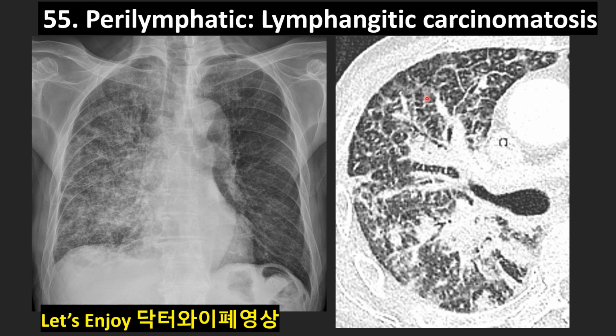Oh, uncountable. So many pleural nodules, so many nodules and masses in the bronchovascular bundles, even without normal findings. And we see many septal lines thickening over here and here. And in the central portion, there are also nodules. We say in this case, this is the prominent central core. And this linear line showing arcade sign. This is lymphangitic carcinomatosis. Most of them are from lung cancer of ipsilateral side and sometimes from breast cancer with bilateral involvement.